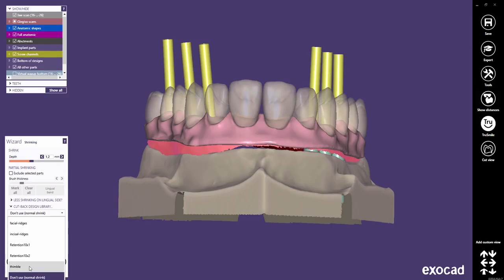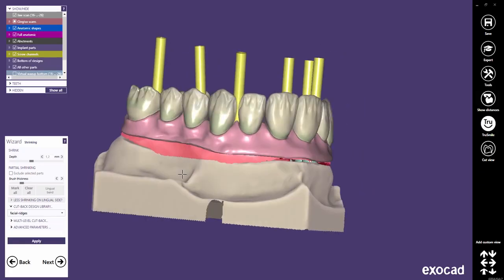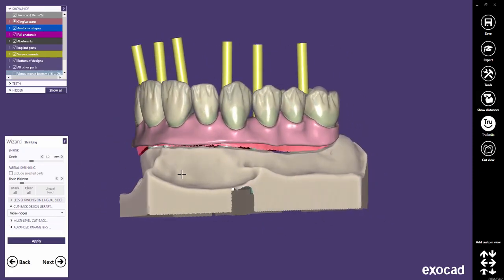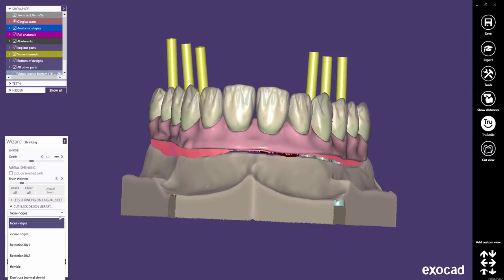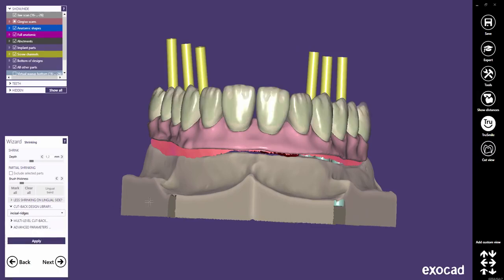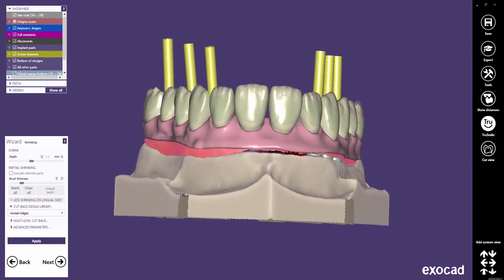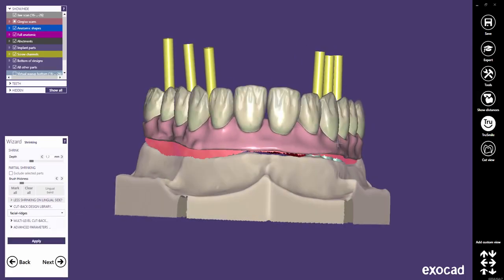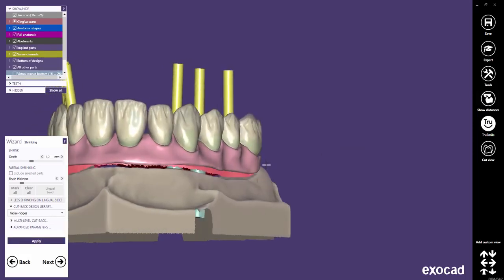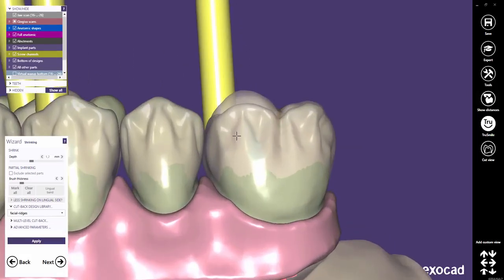Let's start with facial ridges. These will reduce the tooth with ridges on the facial side where the incisal edge remains untouched. The incisal ridges affect the facial and incisal side. As you may remember, we have added material on tooth 16 and removed material on tooth 26 during freeforming at the beginning of this tutorial.